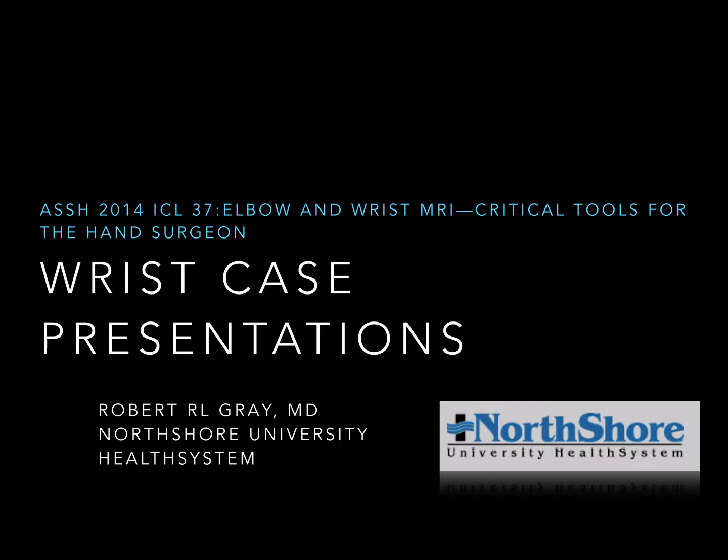My name is Rob Gray. I'm an orthopedic hand surgeon in practice in the Chicago suburbs, and this is part of an instructional course lecture that I moderated at the Hand Society in 2014 in Boston, entitled Elbow and Wrist MRI, Critical Tools for the Hand Surgeon. This is my section on clinical correlations for how I use wrist MRI in my practice.